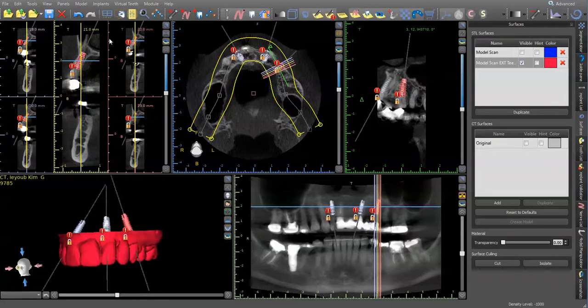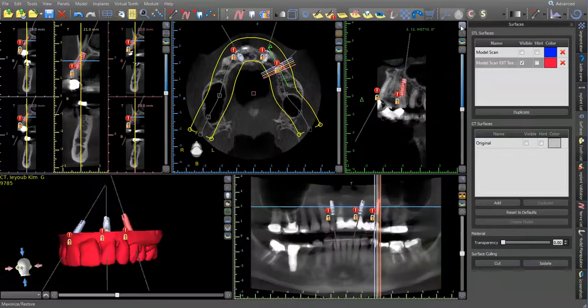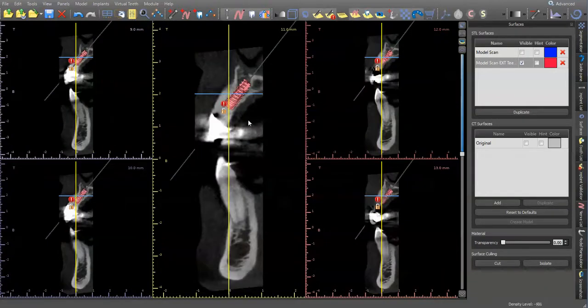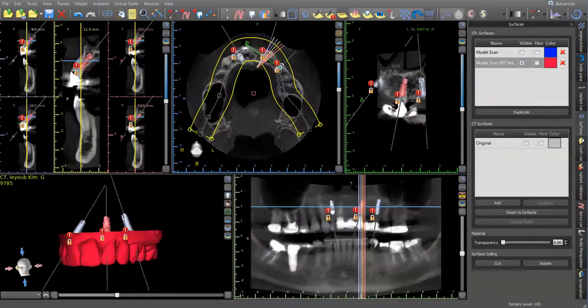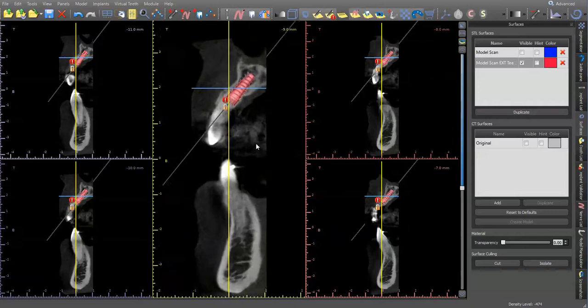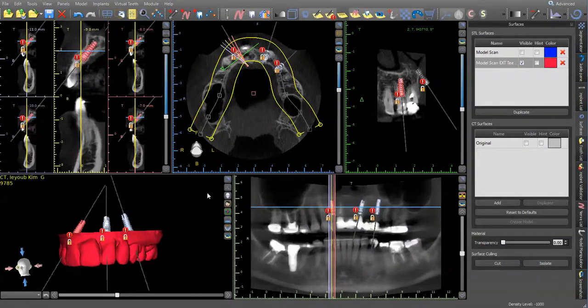So in cross-sectional, you can see that it's real thin buccal plate. This is implant number 12, and number 11 site, but this is removing the canine. A little bit better bone just because of the canine eminence. And we have like this peg lateral that's really not a good bone at all. Real thin. These are all 3.5 by 10.5 implants.